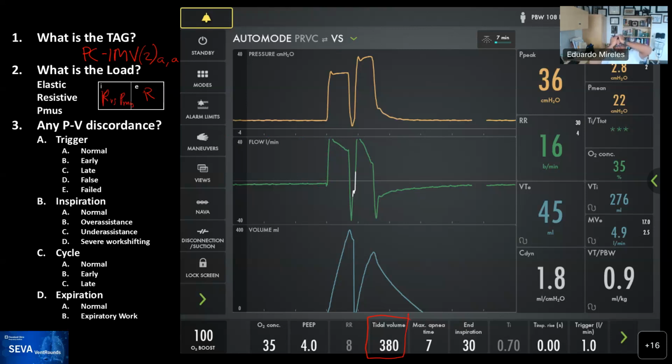I was standing in front of this ventilator for a while, and they were presenting me another patient, and my eye was looking at this ventilator. I was like, what's happening there? As I looked at it, I said, well, the patient is not triggering the breath. And you can see that as the first pressure depressurizes, the breath ends, and it goes below baseline. That could be a marker that the patient is doing effort. So that would go with what some of you mentioned as early trigger, because this is not a breath triggered by a patient.